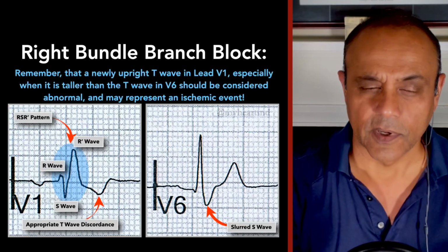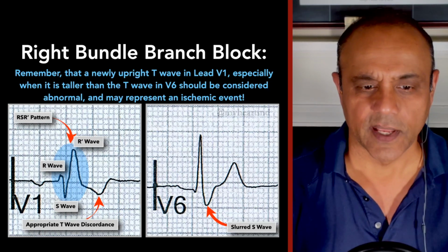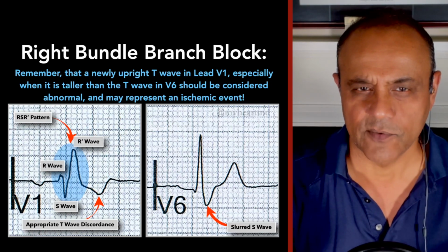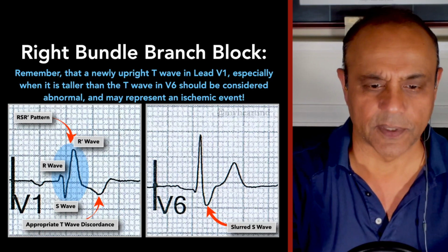All right, and remember, a newly upright T wave in lead V1, when it's taller, especially taller than in V6, that is very concerning for things like ischemia. So never make that into nothing. Always pay attention to it.